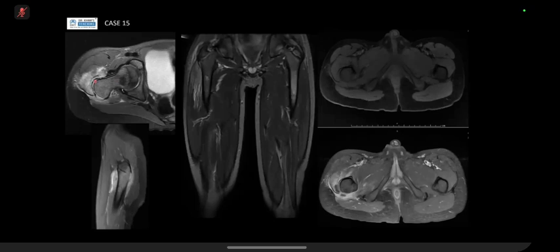Okay, thank you. And this is osteomyelitis. So you've got soft tissue edema. You've got this periosteal elevation. This is a T2 fat suppressed, and you can see marrow edema here between the greater trochanter and the epiphysis, the metaphysis. And this is the apophysis, which is similar to the epiphysis, just that it doesn't add to the lengthening of the bones. This would be the metaphysis, as you normally know in your long bones. Soft tissue edema shows again on a coronal.